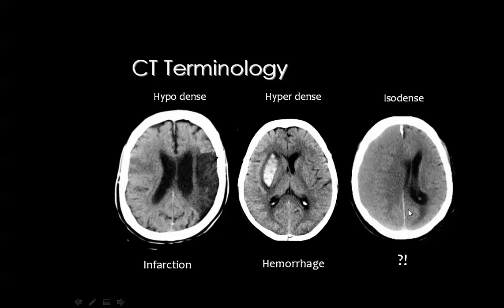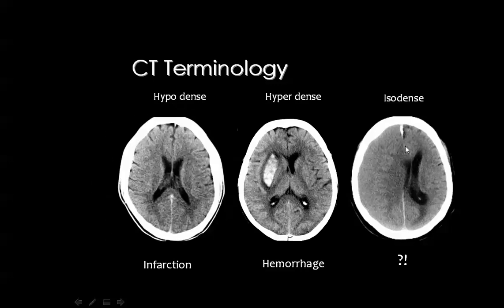the normal brain structures. As you see in this case, normally you will see the ventricles, the left one and the right one, standing on either side of the midline plane. But in this example, you can see that the right lateral ventricle is compressed and is contralaterally displaced to the left side across the midline. Then there should be a lesion here that has compressed the ventricle and displaced it to the opposite side. And because we don't see the lesion, we will say that this is an isodense lesion.